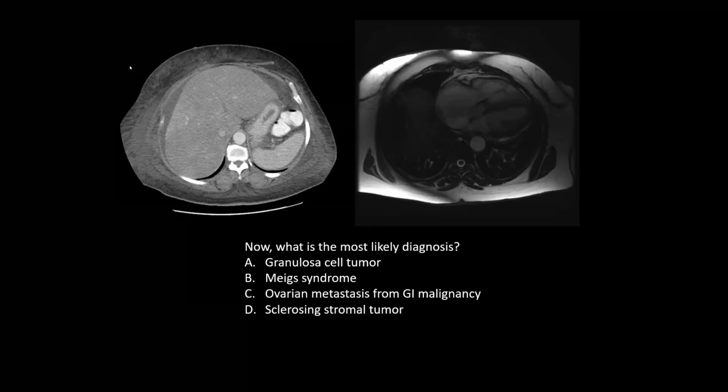We see generalized subcutaneous edema in the form of anasarca, ascites, and passive hepatic congestion. We have also selected MRI images of the heart showing a low signal intensity jet at the expected location of the tricuspid valve. So upon assessment in the dynamic images, this was regarded as tricuspid regurg.